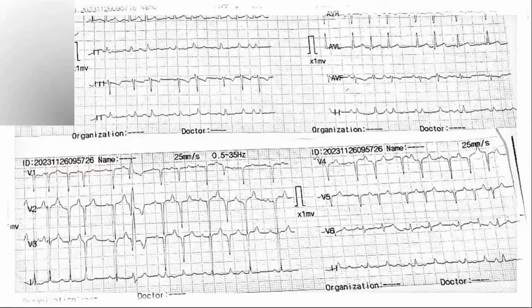So just have a good look at these ECGs. I'll give you a few seconds, and then I will request somebody to please comment on this. This is again a very interesting thing. Just take a moment and then we'll discuss this.